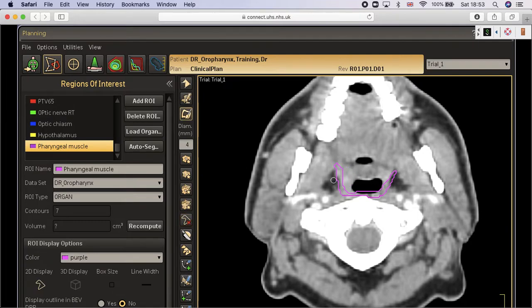Good. There is another trick here. So when you go down easily, 2 millimeter thickness along the lateral wall of the pharynx. Don't take the prevertebral muscles. Take the mucosa. Midline is raphe. That's it. When you go down, you will see something very interesting.